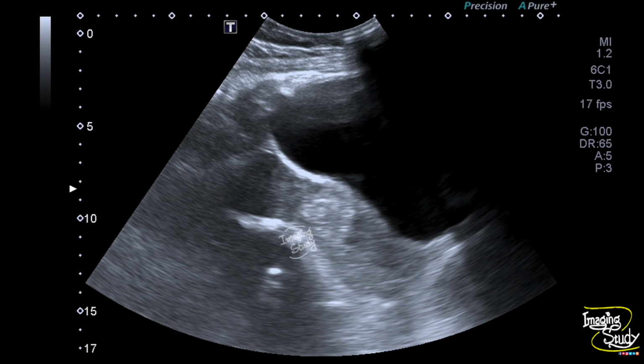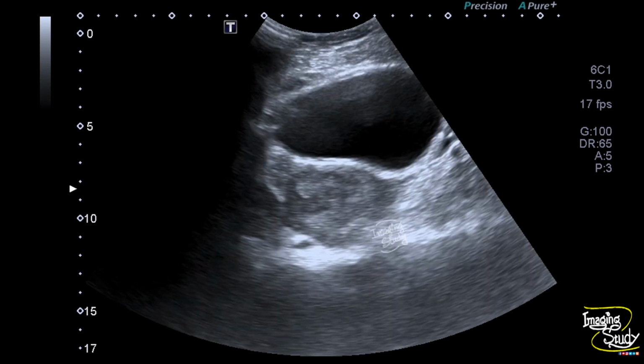This is the longitudinal one, and you can see the hyperechogenic clot or the retained products at the uterine body, and this is the collection. This is the transverse section, and you can see the collection with a defect quite well here.